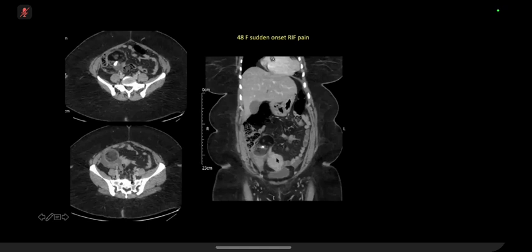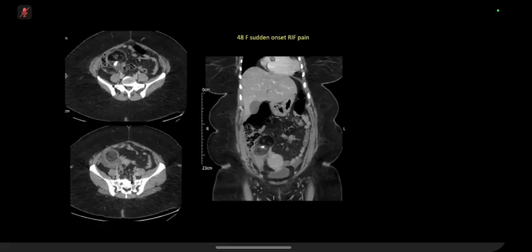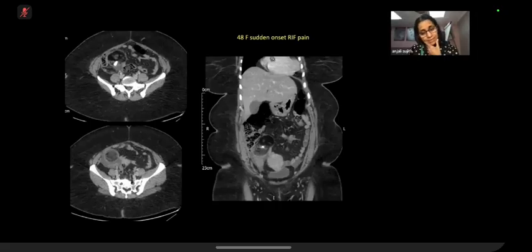And there's free fluid on both sides of the pelvis. So I think this is in keeping with a torted ovarian dermoid cyst. Differentials include hydrosalpinx, but less likely. Sorry, what was your differential? Possibly hydrosalpinx or an ectopic pregnancy as well, but I think my top differential will be a dermoid cyst, which is torted. Okay, so this is a torsion of an ovarian dermoid.